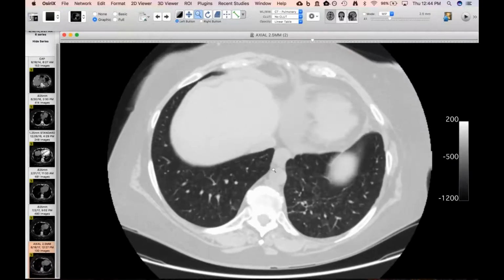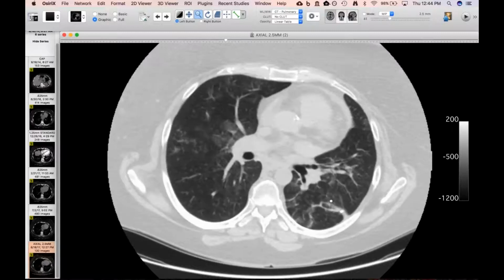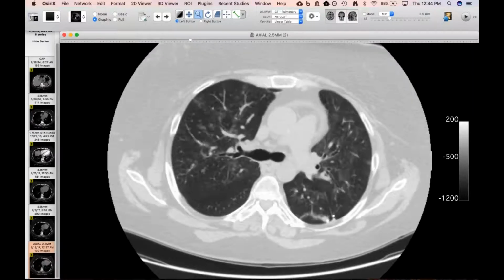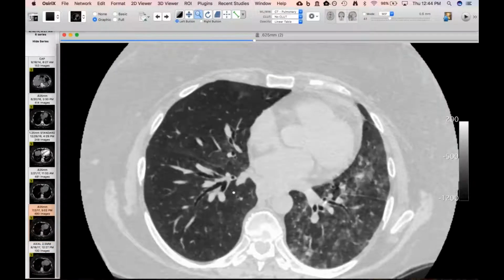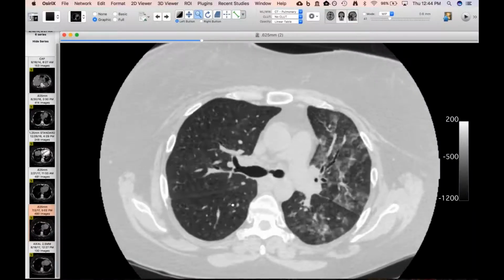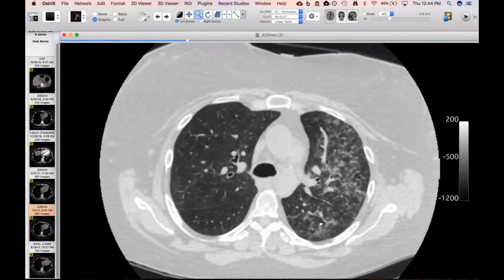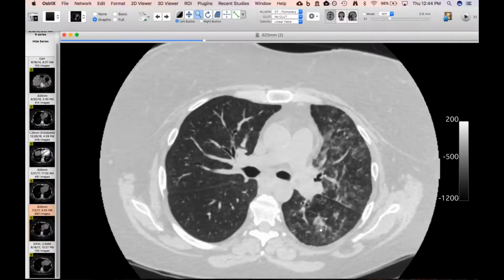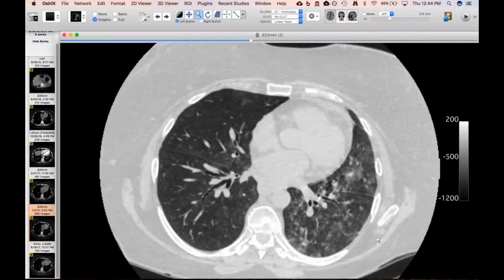I didn't really go back to that, but she had an open lung biopsy. As you can see, she had a surgical lung biopsy on the left, and she did have some foreign vegetable material and whatnot in her airways. So it was a confirmed case on path of aspiration bronchiolitis. Other than the fact that they're centrilobular nodules, which makes you think of a cellular bronchiolitis, it's recurrent and asymmetric, at least on one of the studies. That's what led us down that direction.